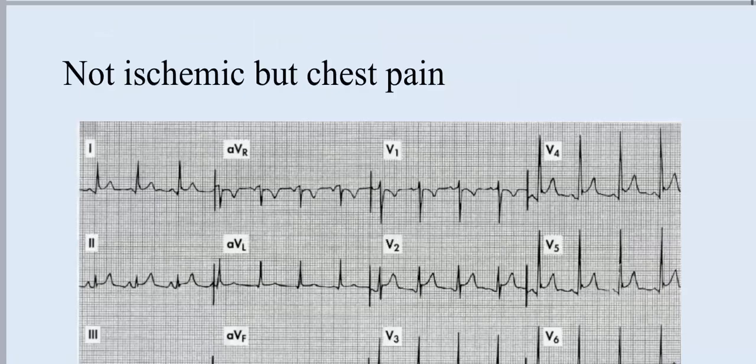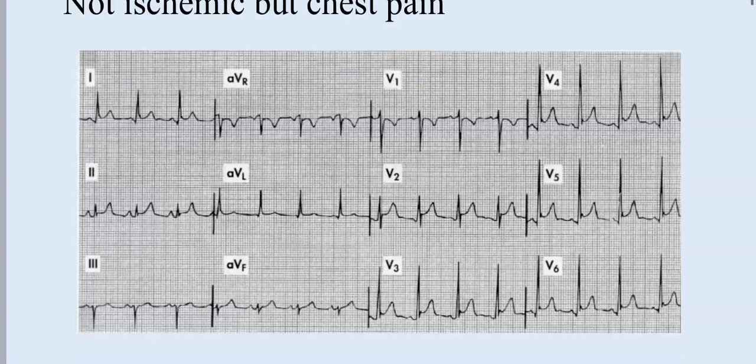Not ischemia, but chest pain. So what do you think about this? What is this? Pericarditis. Why did you say that? Widespread ST elevation. Okay. I think it's early repolarization pattern. Early repolarization pattern, exactly.